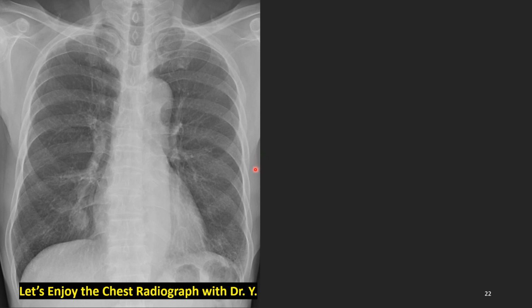This is the last case of this session. What do we see? How do you feel now? Very confident? Interested in the chest radiograph, or very fearful, dreadful about the lung cancer? Okay. We see a 2 cm nodule here in right lower lung zone. Is that all? Let's find out something more. How about his basal lung? Looking not good. Honeycomb lung. Chronic, prolonged smoking history. Yes, probably his lung is not good.